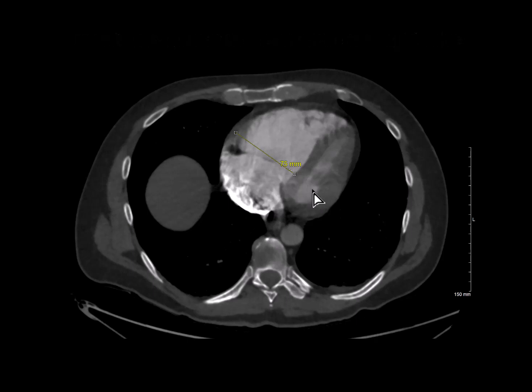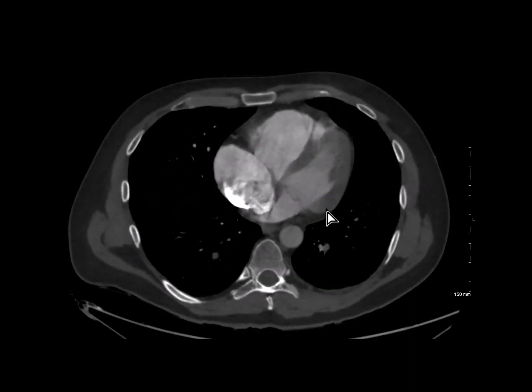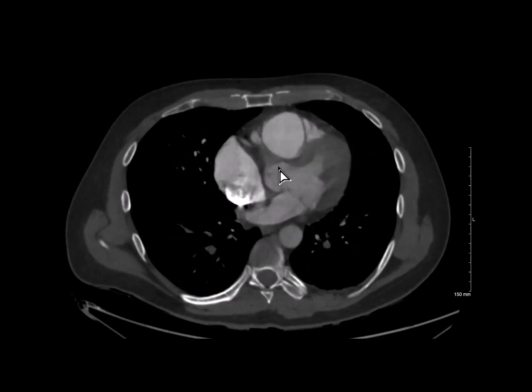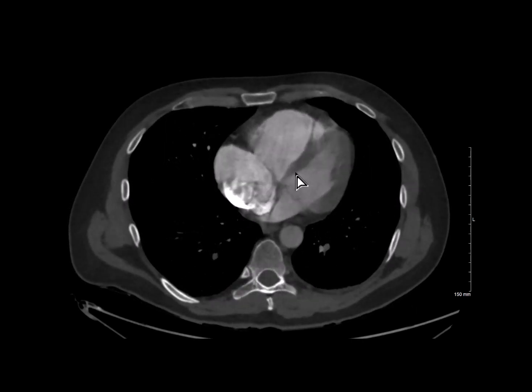Now I won't measure the left ventricle value here because if I go further up it seems a little larger, and if you get too high up you go into the left ventricular outflow tract and the aortic valve. So you're looking for this, focusing on the interventricular septum, probably about here, going all the way out here will give me a decent value.